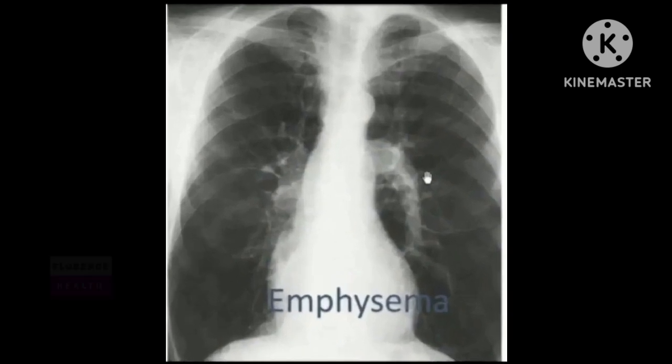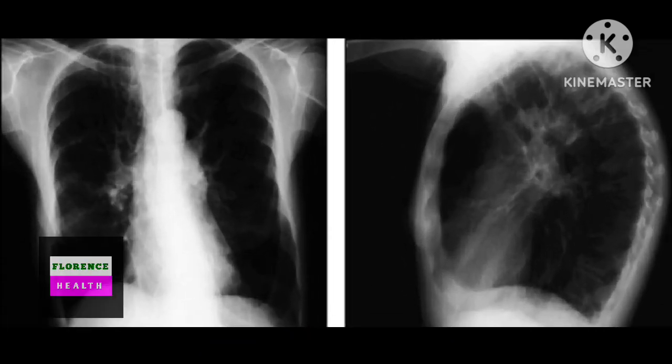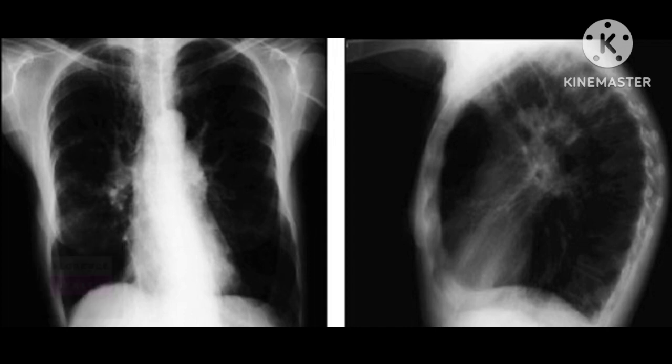Look at the X-ray features of emphysema where all previous features are present, with bulla with its margin seen. Look at the X-ray features where more than 9 or all ribs are visible above the diaphragm, with flattened diaphragm, small tubular heart and black or dark lungs having loss of bronchovascular markings.